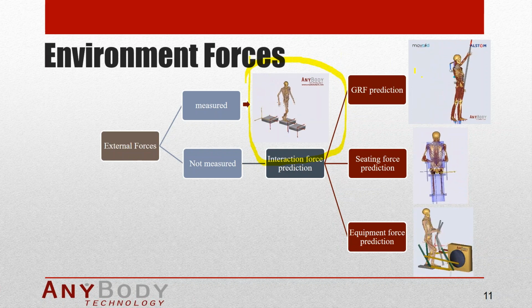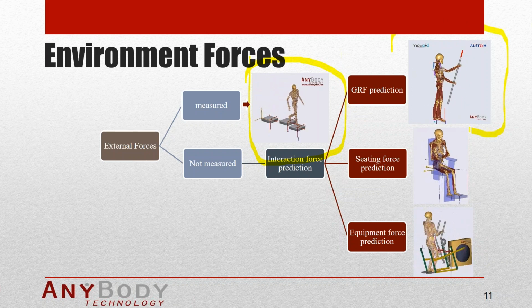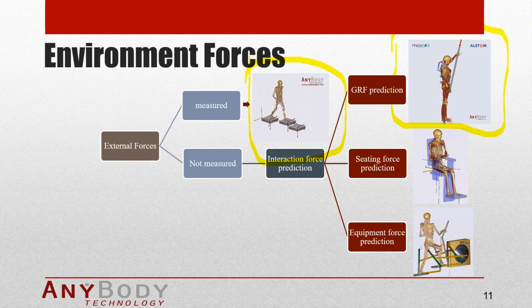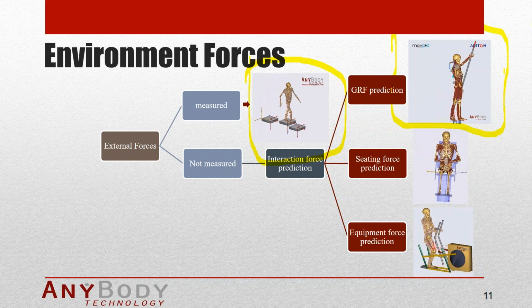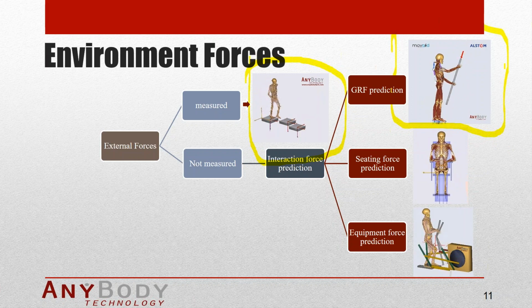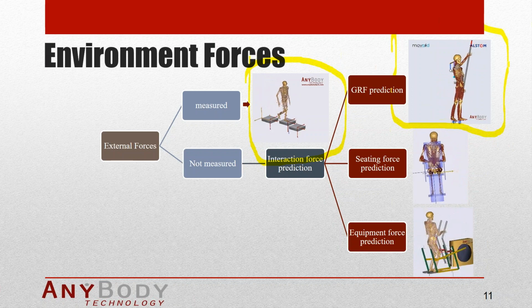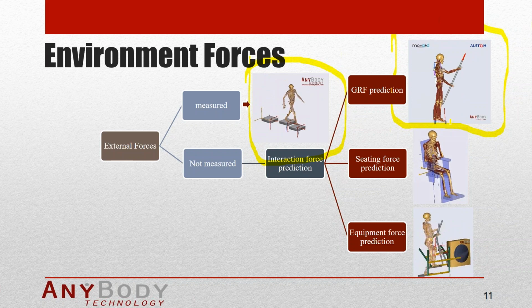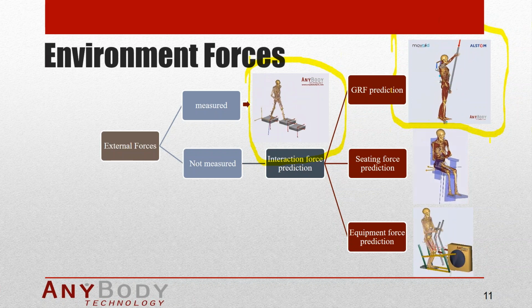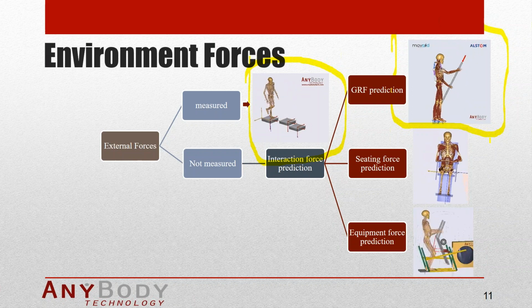Take a look at the video up here at the top, where I can highlight that one, where you can see a model that's performing some operation with a stick. It could be washing windows or something like that. And you can see under the feet of this model, you can actually see the ground reaction forces being estimated by the system, by the technology. And this is a simple matter of dynamic equilibrium.